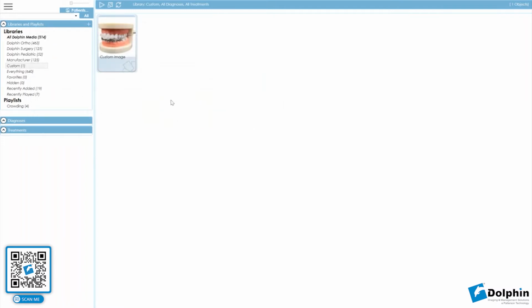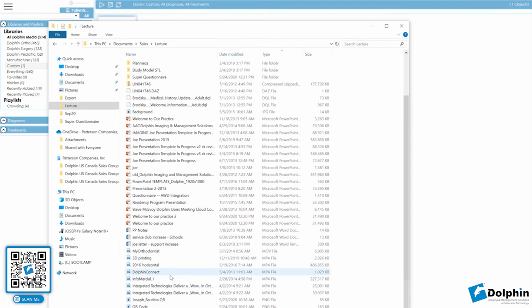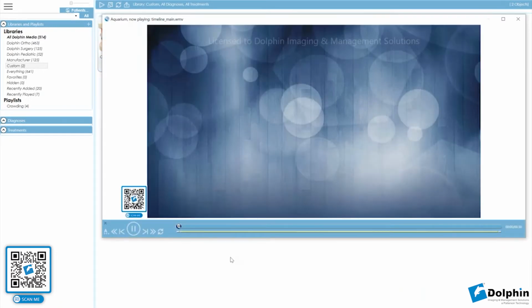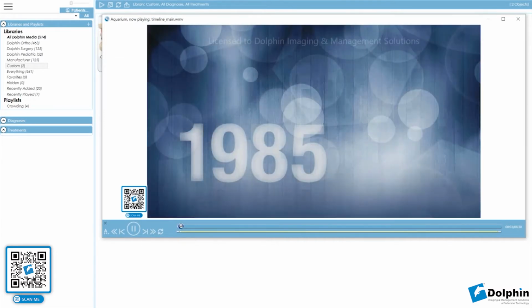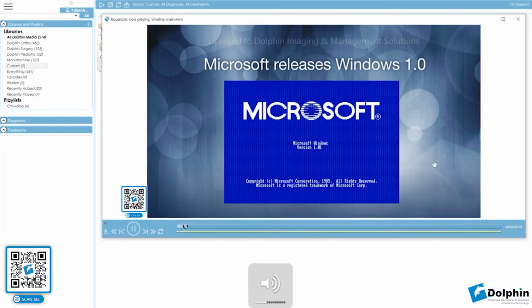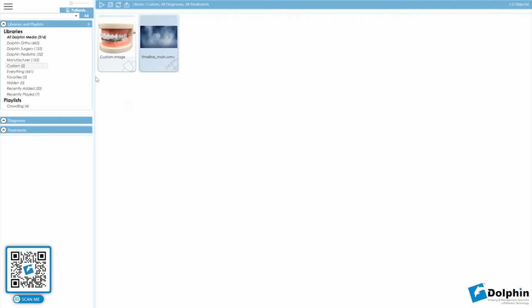And say, okay. If you have your own marketing videos that you have in your practice, you can add those as well. You can simply go to the video that you have. So I think I have a video here on my computer that I can click on and drag and drop into Aquarium. And that will upload that video here as well. And I can double click on this video and it will go ahead and play in real time. And I'm going to go ahead and turn off the sound here. So it's very easy to add your own content to Aquarium.